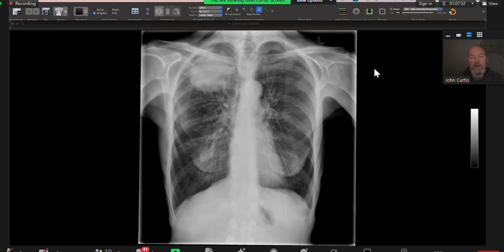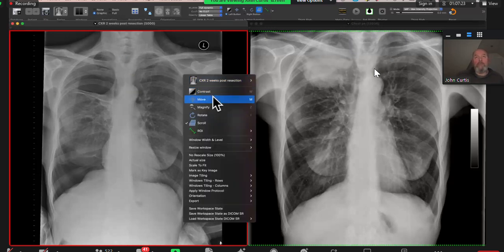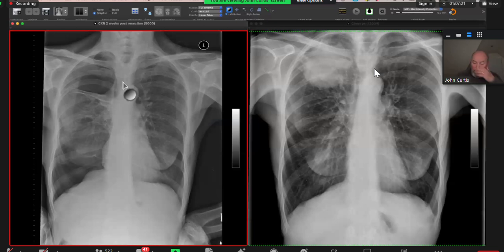What's the most likely diagnosis given that story? Lung malignancy, adenocarcinoma of the lung will be my top differential. Actually, it turned out to be a squamous carcinoma of the bronchus, and it was resected with a right upper lobectomy. Two weeks after the operation, the patient returned with this X-ray on the left. Tell me what's wrong there.